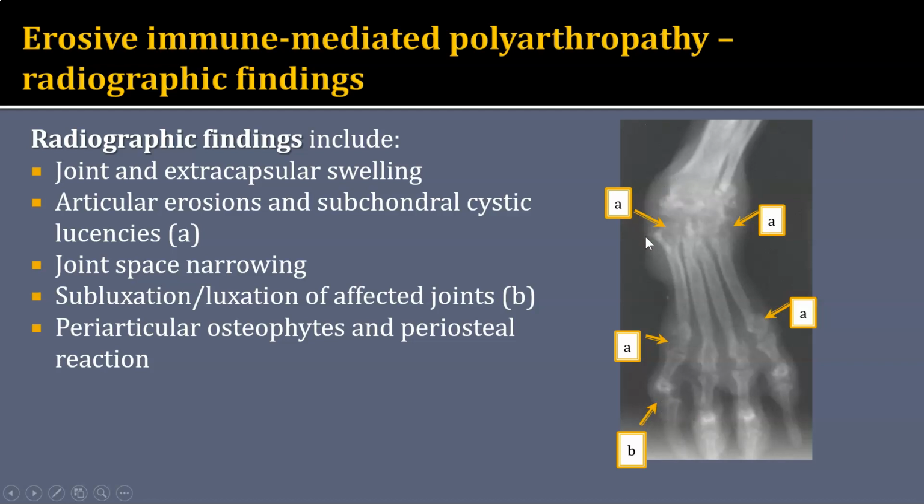And then looking at the carpus relative to the metacarpus, notice the metacarpus is actually laterally deviated. So this patient has actually developed carpal valgus because of laxity of the soft tissues. This patient doesn't really have too many changes on this view, but we can sometimes see periarticular osteophytes of degenerative disease and sometimes periosteal reactions that are probably from enthesopathy at the attachments of the joint capsules.